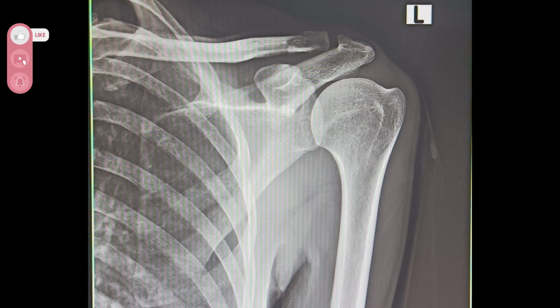We perform this essential X-ray for various important medical reasons and diagnostic purposes. In this X-ray image, what we can clearly discern is a significant fracture located within the clavicular area, indicating a break in the collarbone. This X-ray examination is primarily done for critical reasons such as diagnosing shoulder joint dislocation, identifying various types of fractures, and assessing other related musculoskeletal conditions.